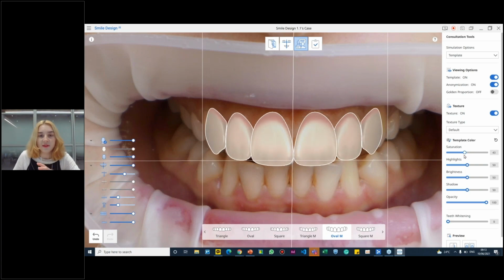And when it comes to texture, we have 3 types of texture. One is our default texture, which is really good, and it's like a chameleon kind of texture. Once you adjust the color, it can basically suit any shade, and it's really great in a lot of cases. And with the recent update, what we did is that we introduced these other 2 texture types.